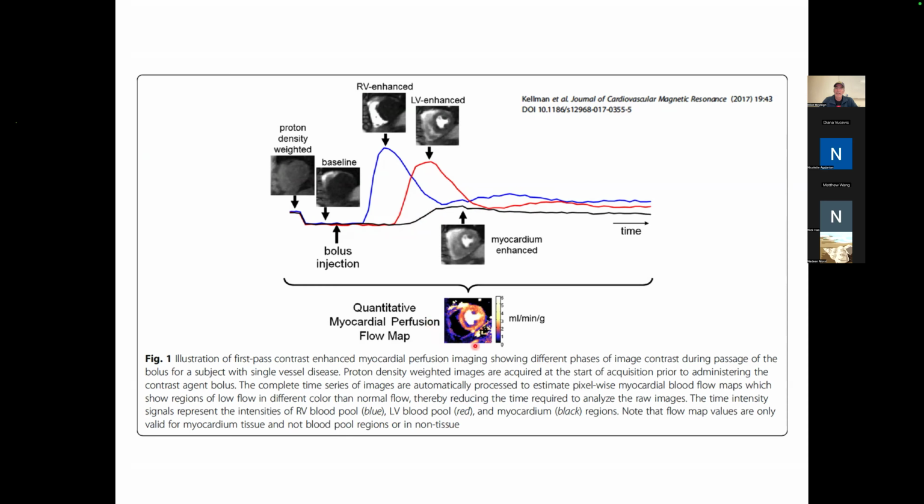And then we can look at the shape of this various input function. I think the input function is fine to use the left ventricle for the myocardium because it just goes out the aorta and then down the coronaries. And so the timing of how the coronaries are being fed is essentially this curve here, the left ventricular curve.